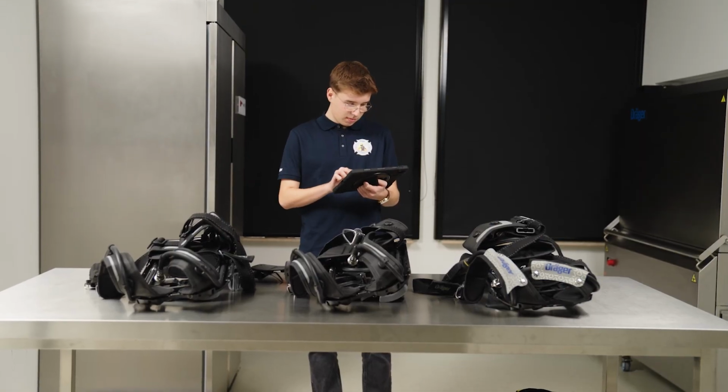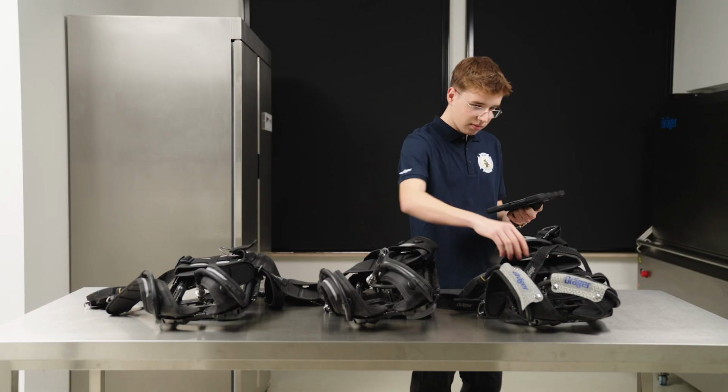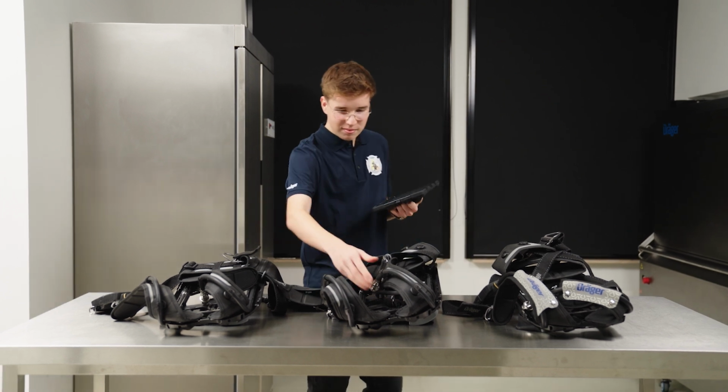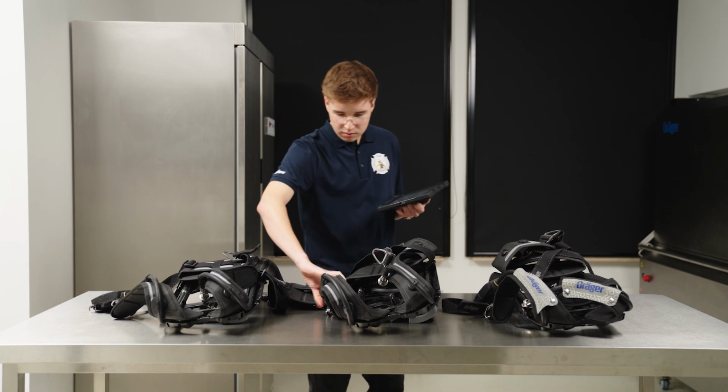Under Task, select the Test Type and complete the required fields. These fields can be defined under Configuration according to the manufacturer's standards and specifications. Refer to the video or section Configuration for more details.